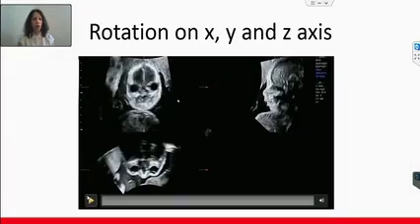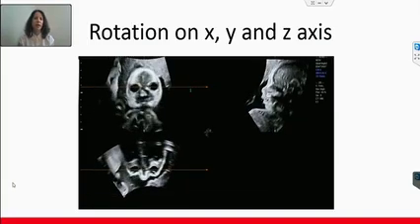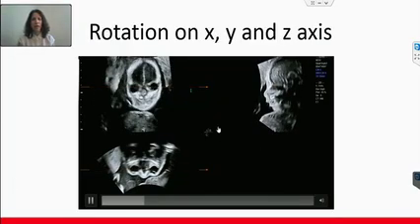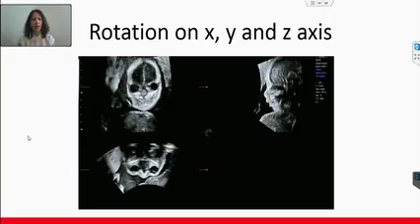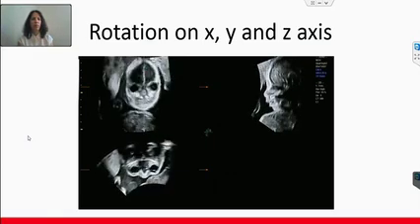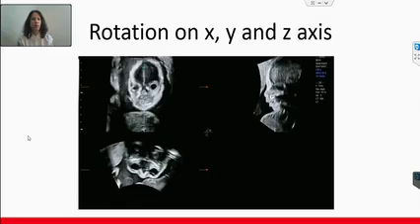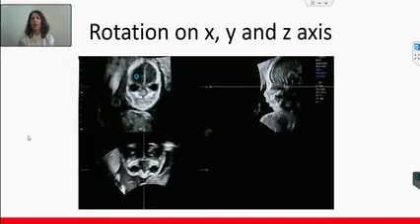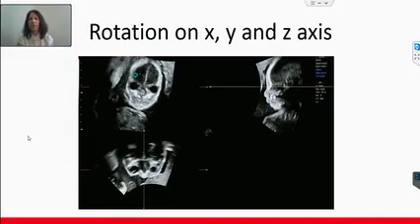Now, when you have this knowledge, I want you to look again at the volume of the rotation of the head. So the x-axis rotation, you see that both are x-axis rotation. It's like the fetus says yes. And now the fetus moves on the y-axis. I could say no. And now you can see the z-axis rotation.